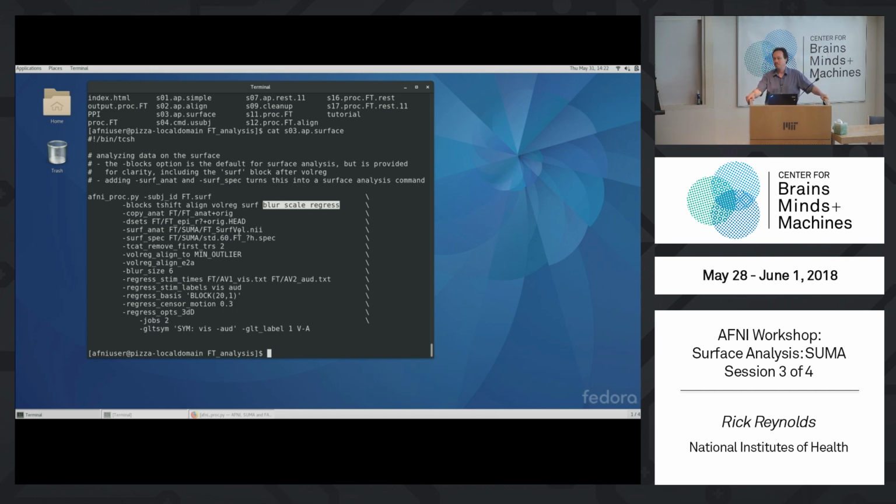No big deal. It's much easier for you to keep yourselves organized if things are just in separate directories, and otherwise, you know what it's like. Data gets messy very quickly. So, in general, even if you make one change to afni_proc and you continue, even if your change is at the end, like in the linear regression, should I just fix my 3dDeconvolve command? No, just rerun it. Your computer can handle rerunning it. It's easier for you. So now we have similar options.